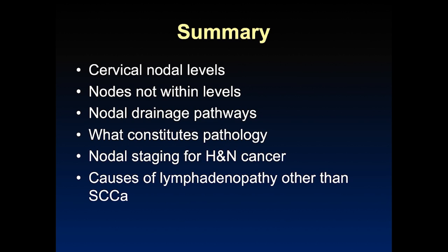We reviewed nodal staging for head and neck cancers. Remember, for most of your head and neck cancer metastatic nodal disease, you have one staging scheme, but nasopharynx cancers and HPV positive oropharynx cancers have their own staging criteria. And finally, we looked at causes of lymphadenopathy other than squamous cell carcinoma in the neck and how you can use the imaging characteristics such as hyperenhancement and calcifications to help guide your differential.